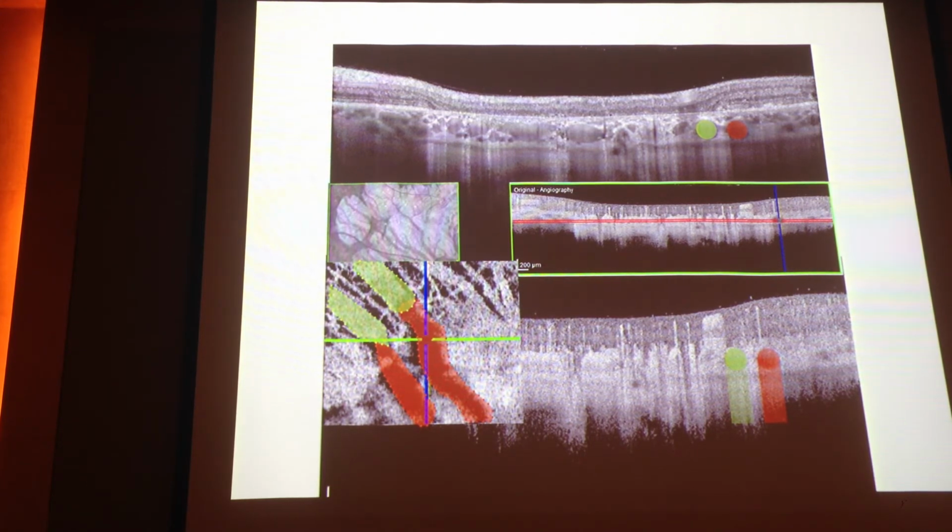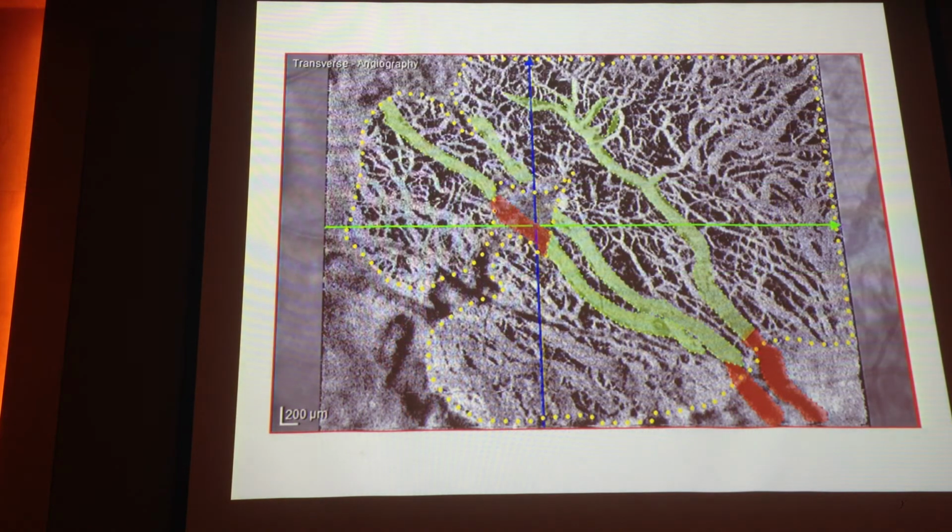Now, but why at this level, deeper than the choriocapillaris, do we have white between vessels? It cannot be, there is no vessel over there. So here is the projection effect, or artifact, as you want to call it. And so between the two vessels, we see white here just because there is choriocapillaris. So if we sample here, this white part is due to the presence of choriocapillaris.